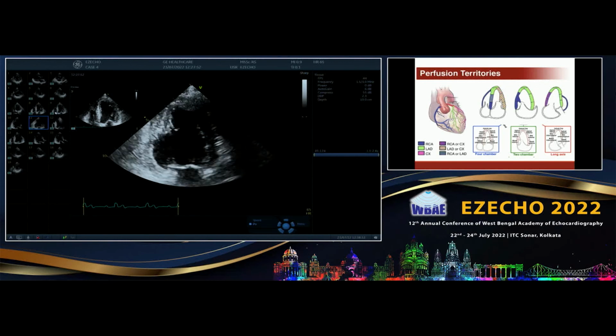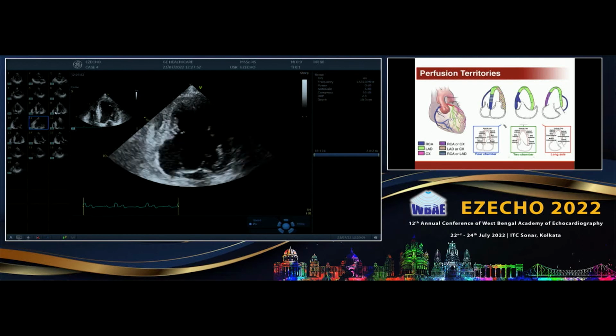But there is a small caveat, Nitin, is that the apical images are only giving us subendocardial fibers. So that is a problem. And the short axis images are giving you all fibers, predominantly circumferential and subepicardial fibers. But to make it more easy, remember that in both the planes, they should go hand in hand. Hypokinesia, especially in stress echo, is much better seen in the long axis than the short axis. Because in short axis, the thickening is also because of the spiral fibers and epicardial fibers which push the endocardium down. But thickening is something which we are talking about.